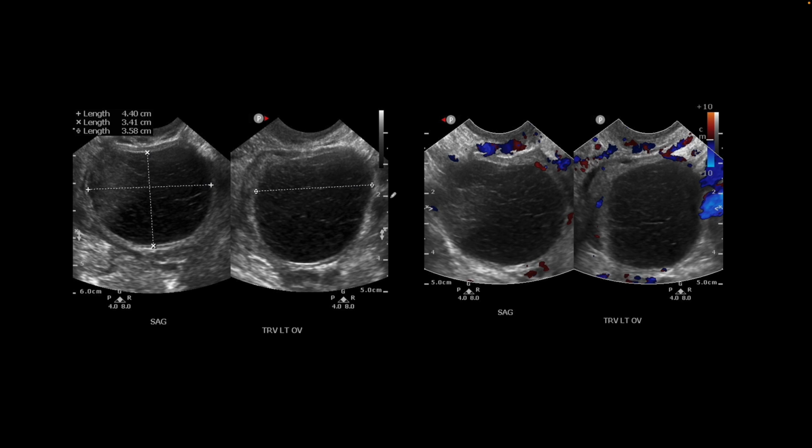All right, so moving on to an ultrasound. This is an ultrasound of the pelvis in a young female who presented with pelvic pain, and the ultrasound shows this cystic focus in the left ovary, and on the left images it has been measured, and we have 2 views, sagittal and transverse. It is a cystic focus with posterior acoustic enhancement and some low-level internal echoes. And this finding is characteristic of a hemorrhagic cyst.